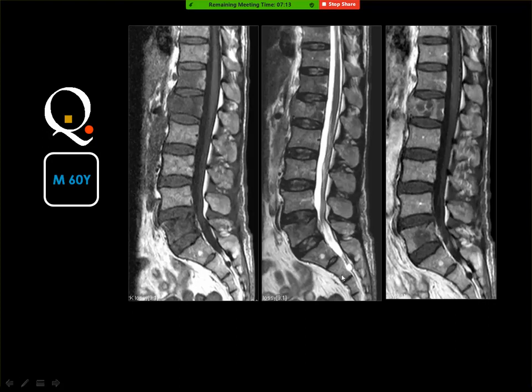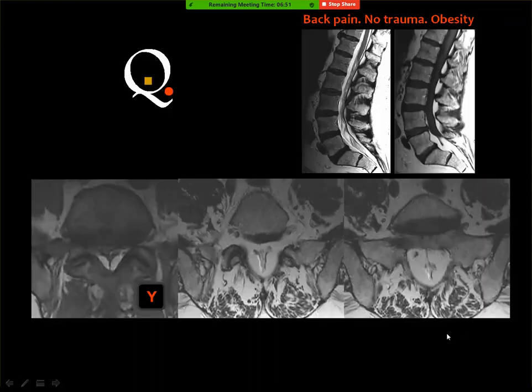Then what do you think of this? Metastasis. Okay, and these are metastatic deposits. As we have mentioned before, you got spinal deposits. A lesion here, another lesion here, another in multiplicity, and this is the T2, and this is post contrast. Then you consider the possibility of metastasis.